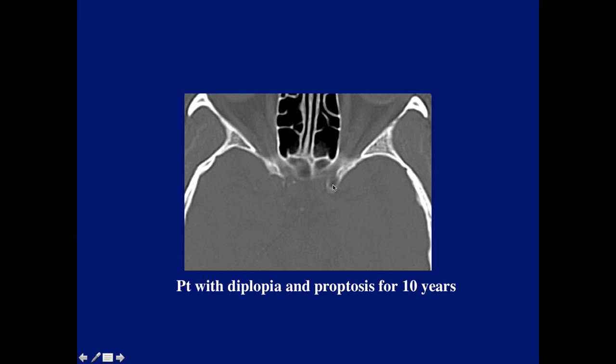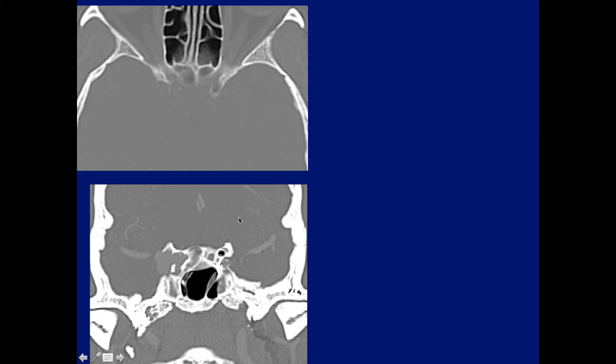Here's the left anterior clinoid we don't see, the right one. Anybody see what may be causing this erosion? Correct. As Dan said, an outline of an aneurysm. Notice the anterior clinoid over here. Notice that the undersurface has been eroded. All we see is the top of the clinoid.